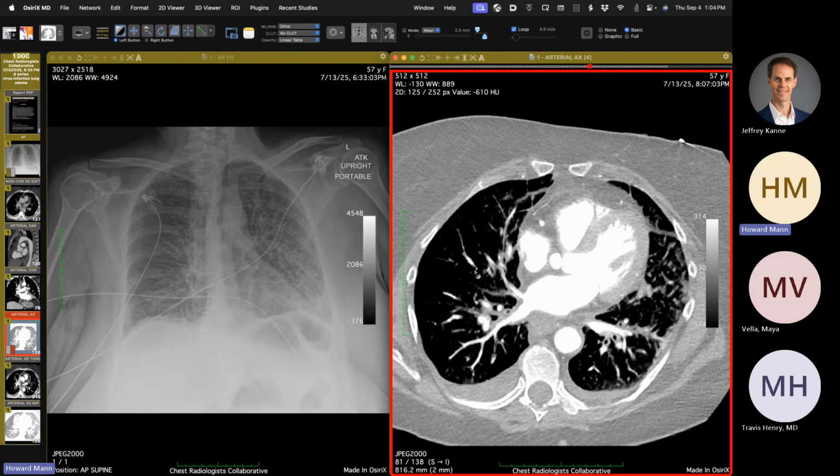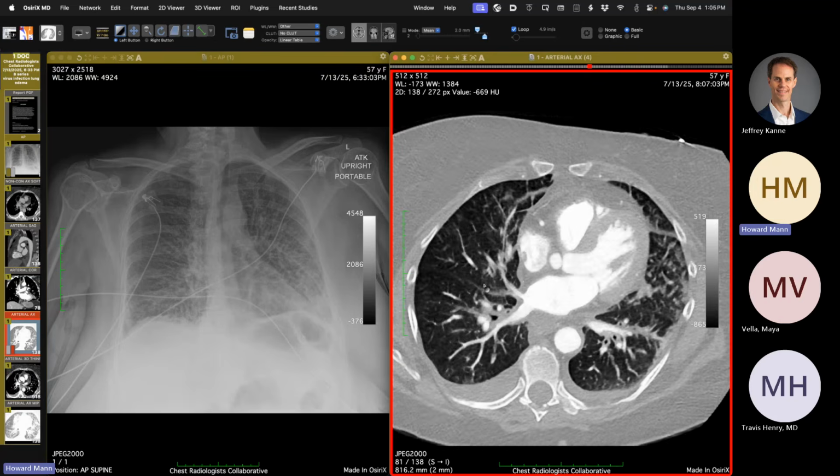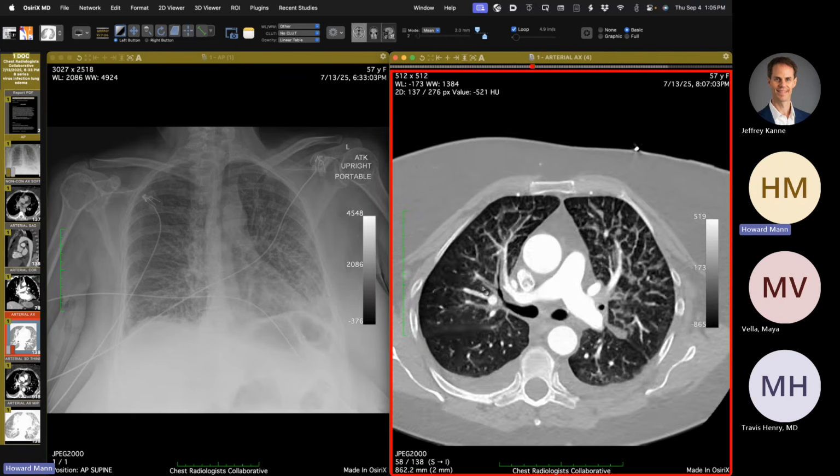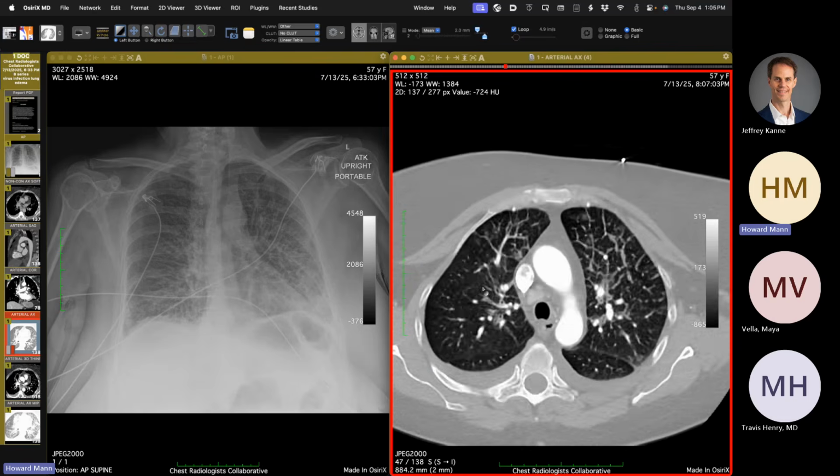And among those, I teach the possibility of pulmonary veno-occlusive disease; tumor obstruction of pulmonary lymphatics may produce interstitial lung edema. But this patient does not have those. So any other thoughts before I give you the history as to the etiology of the florid interstitial lung edema? Or any other things that you typically teach your residents when it's not left atrial hypertension?